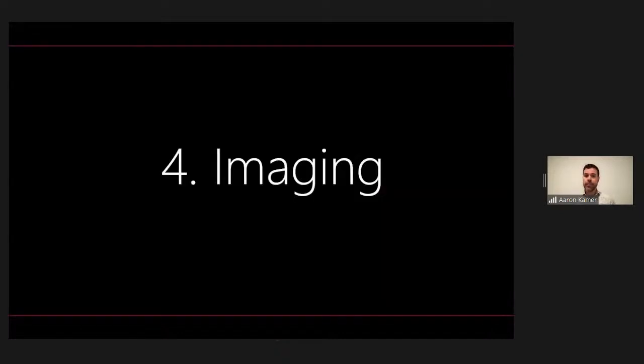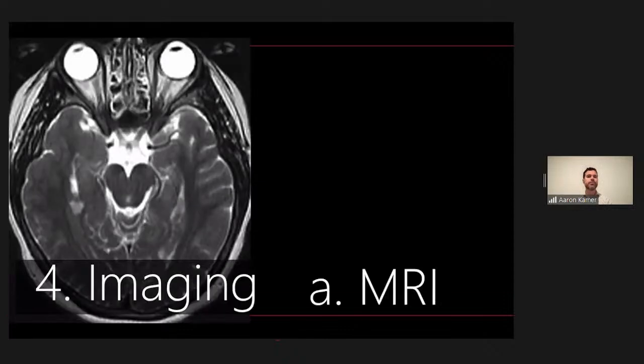All right, now our favorite part, obviously, is the imaging of epilepsy. So we certainly do MRI, and as we get higher and higher field strengths, we can get a better and better look at our patients' brains under MRI. This is a 1.5 Tesla. I've found that our neurologists are pretty adamant and strongly interested in getting 3 Tesla MRI for the majority of our epilepsy patients.